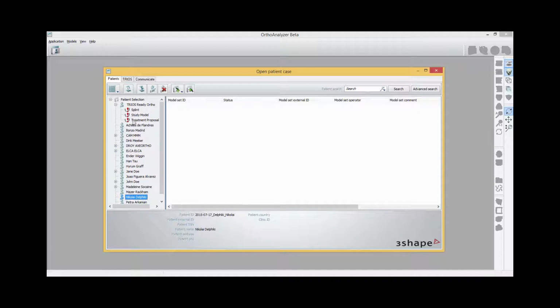That will show a number of models or cases that you're working on. You'll notice that some of these will have a little exclamation mark. That's indicating that it has not been prepared yet. And I'm not going into prepare yet. That will go into the third video. But as soon as you have prepared one of these models here, that exclamation mark will go away.